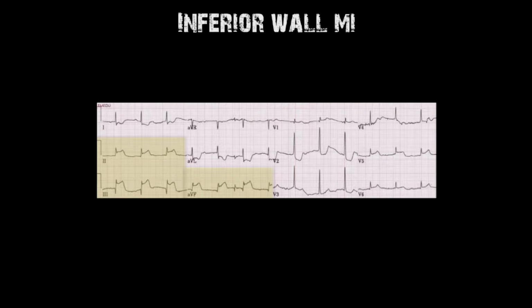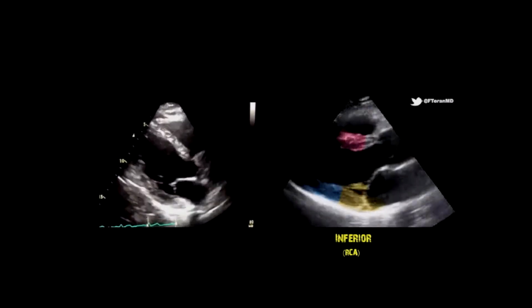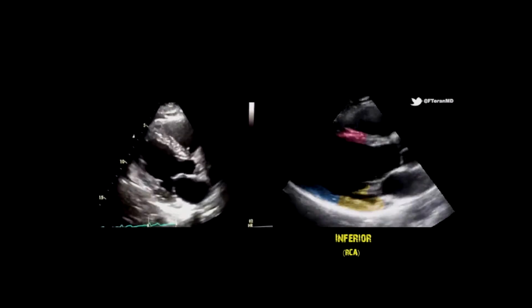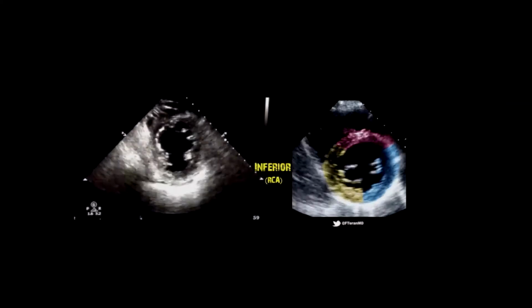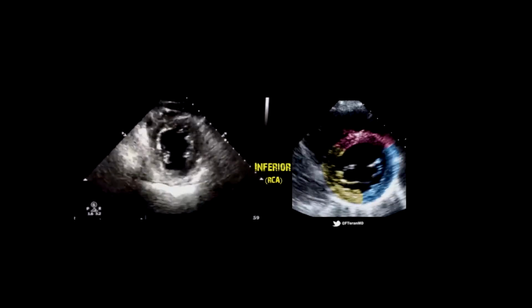Think for a moment, where would you look for regional abnormality in the echocardiogram of this patient? Here it is on a parasternal long view. Pay attention to the same clip now by looking carefully to the inferior wall. You can see how the part of the ventricle is not participating as well as the other segments. What about our parasternal short axis? Where do we expect to see a regional wall motion abnormality here? Look to the inferior portion of the heart and slightly to the left, where the right side of the heart falls and where the RCA would feed to.